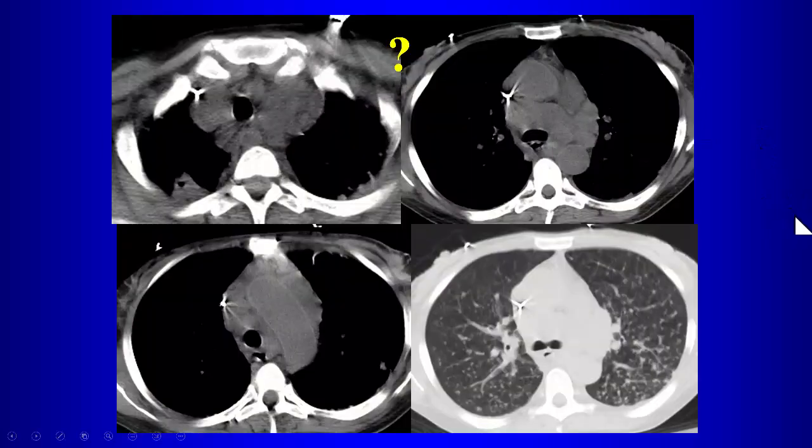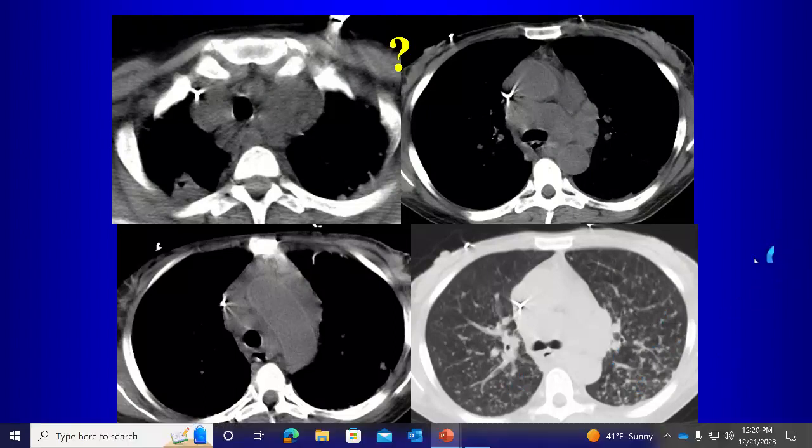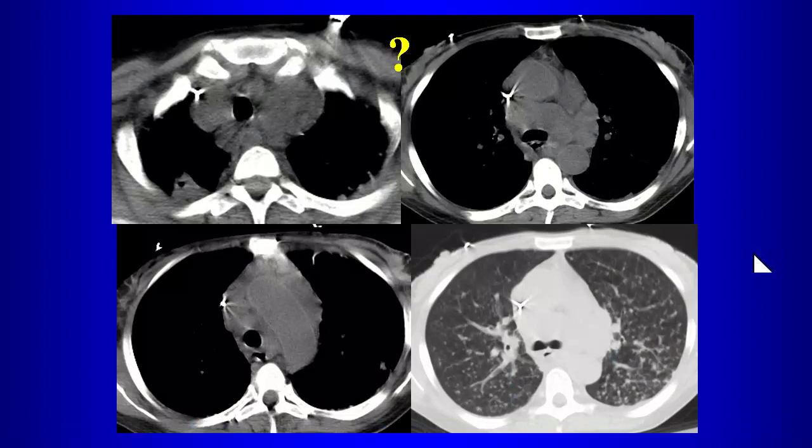Here on the CT we see what? Centrilobular? No, I would say random. Random? Yeah, I think it's random. We see some of these nodules. So what do we think might be going on in this patient? Could be miliary? Miliary what? TB. TB, right? Yes. Also the lymph nodes? Would the lymph nodes be consistent with TB or not? No, not like that. Could you have lymphoma?